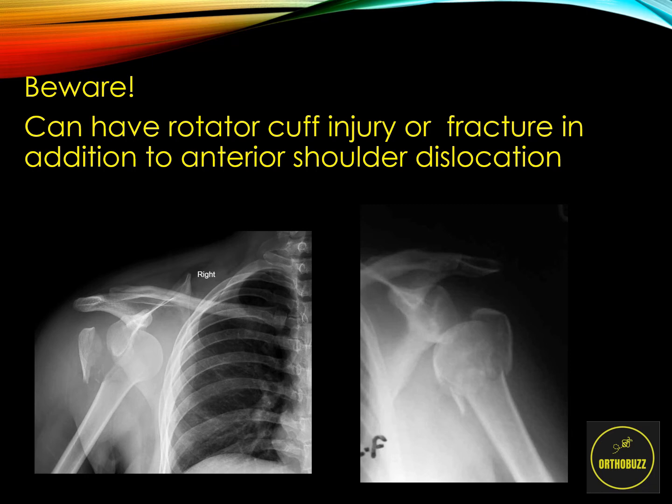As we can see on the right-hand side, the humeral head here is again dislocated anteriorly, as it is not articulating on the glenoid fossa. But this big fragment here is the greater tuberosity, which is fractured off. And therefore this is analogous to a large rotator cuff injury and will most likely need some sort of operative intervention depending on patient factors. This large greater tuberosity fragment may also impede reduction, and therefore this would most likely need to go to the operating theatre to have a reduction.